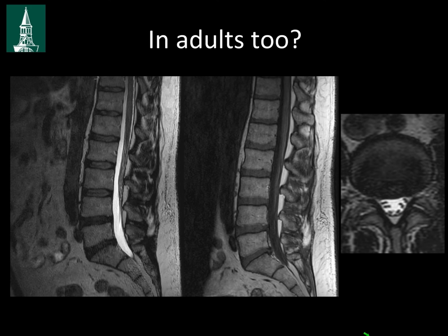And this is not some idealized patient. This is more of your standard American patient. They're pretty good sized. They've got a lot of degenerative disc disease, and yet we're able to really nicely reconstruct these images into axial views. I see a question coming through. Question on reading. Where do you use the MPR tools?